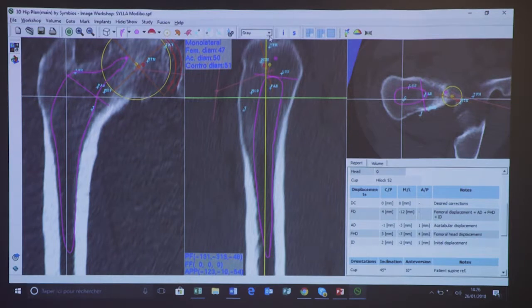And afterwards, when we analyze the femur frame here, you can see many things. First of all, he has really high flare and very thick corticals, and in my experience in these patients, the Corail-like stems, or let's say the Mueller straight stems, don't do so well because we may have a distal fixation. When we assess patients at about 1 year follow-up, they will start to have some lucencies here in zones 1 and 7. It means that basically the stem is doing something like this. It's okay, they will be happy, but we start having some troubles at 6-7 years follow-up.